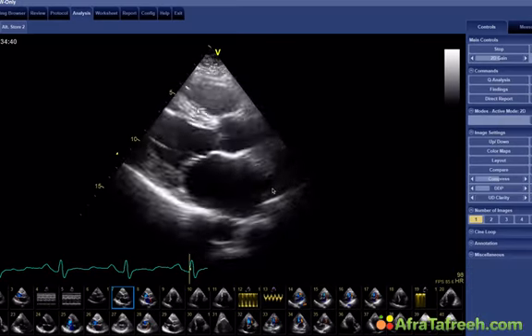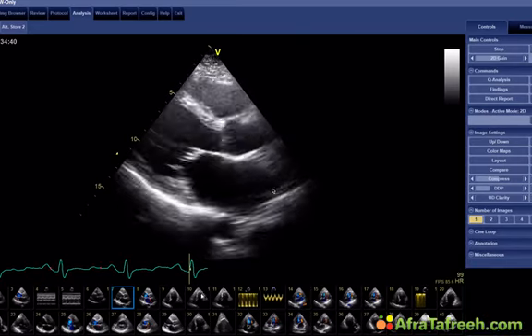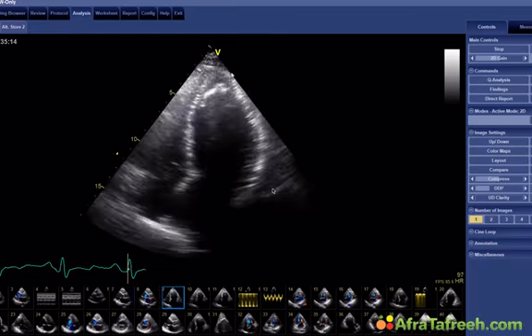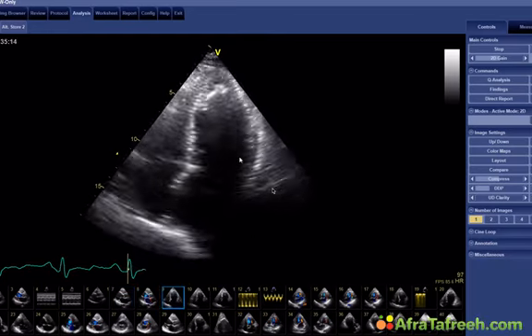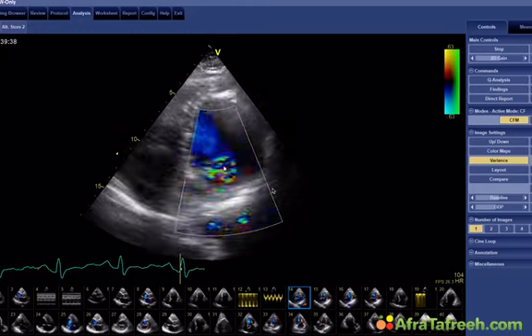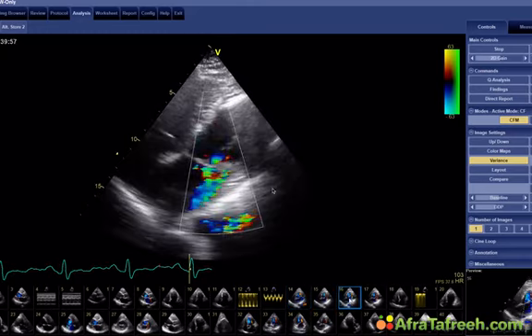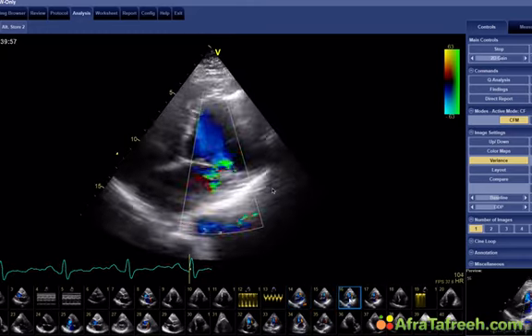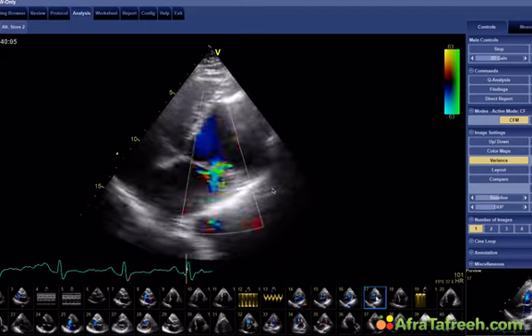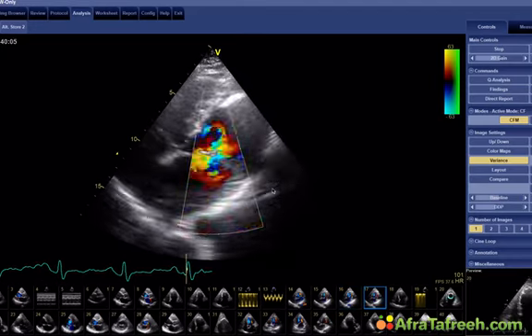The left ventricle is still fairly okay. It does not seem that the patient has significant left ventricular dysfunction. The infiltrate is not changing. It's the same. Mitral regurgitation is more than it was before. His BNP levels were fairly high. It was almost 14,000. Very high values.